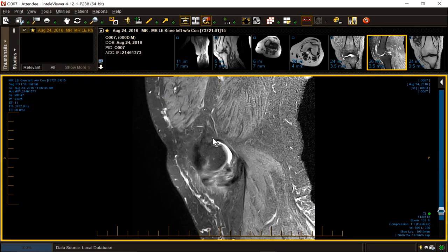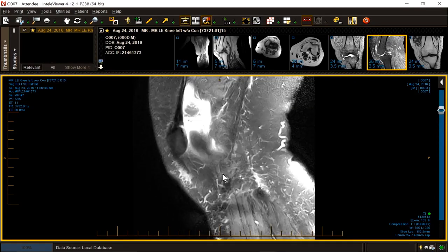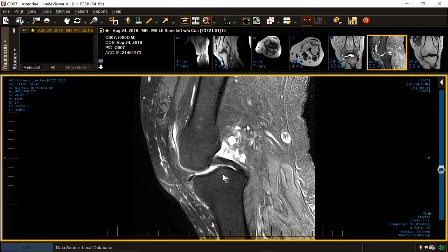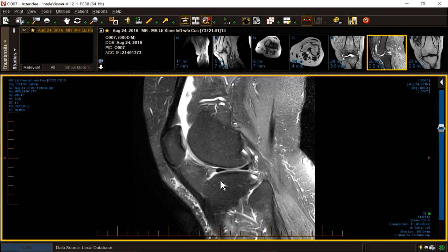So where is all the swelling? All the swelling is over here. It's a bone scan without an injection. You're looking for the hot spots. It's that simple. Yes, there's chondromalacia. Yes, there's an effusion. Yes, there is a body. But the thing that is producing the patient's pain in this case is the meniscectomized area that has allowed the meniscus to become an unstable remnant, wiggling around, going into the gutter, creating capsulitis, and therefore the therapy will have to be directed there. Shall we do another?